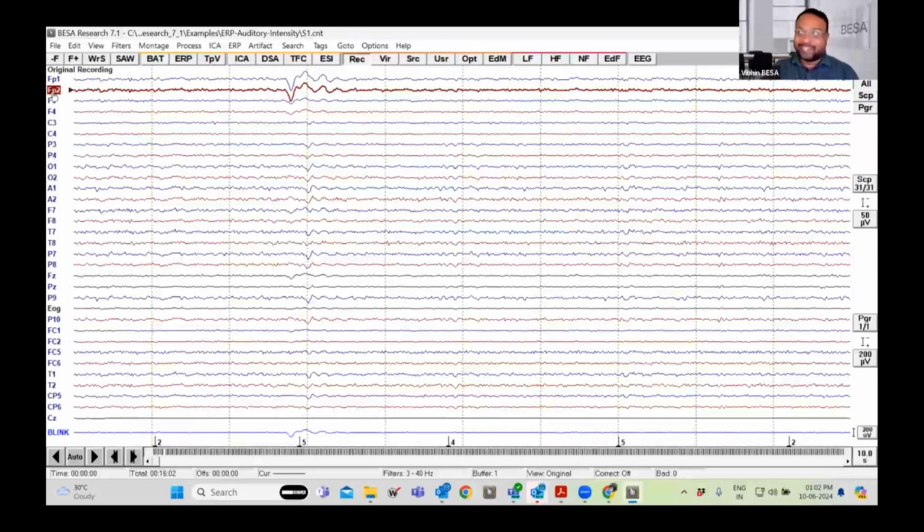That's how I remembered it in the beginning. So right is red, and you also have the black ones, which come over the midline, the vertex electrodes: FPZ, FZ, CZ, PZ, OZ, etc. This is the main system of electrode colors which you see.